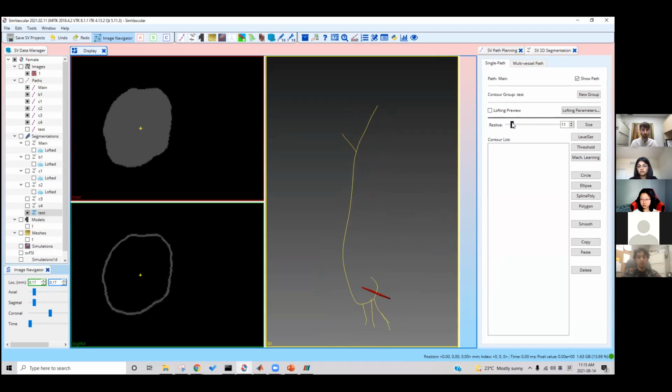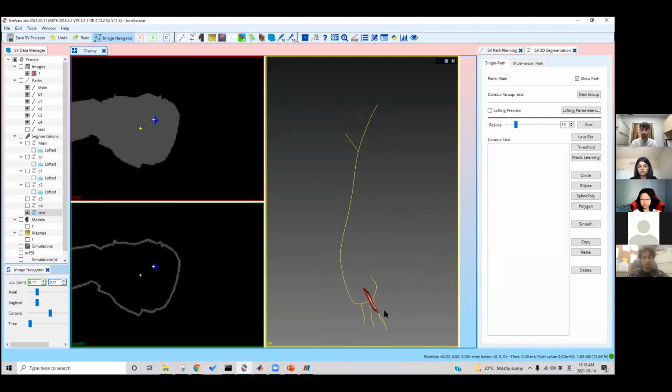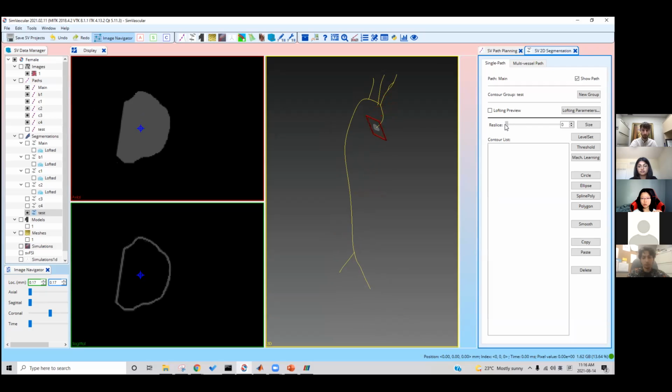It's not going to be very pretty when it intersects with the other blood vessels. So for example, here, when there's a branching vessel, but we're going to have a way to avoid that. Okay, so with each reslicing, your goal here is to have an outline or segmentation of the lumen, basically. You can do this the hard way or the easy way.